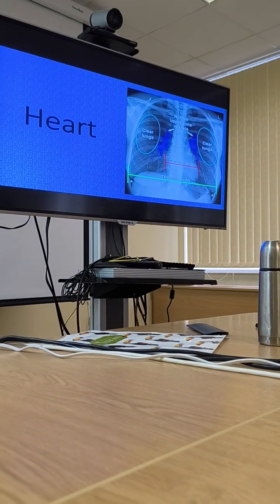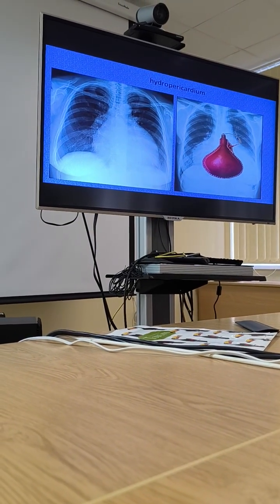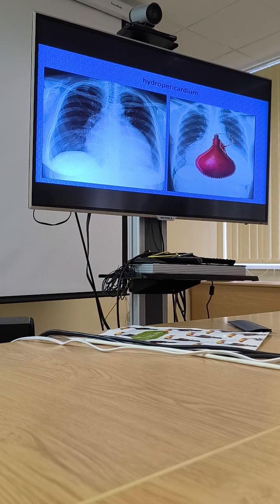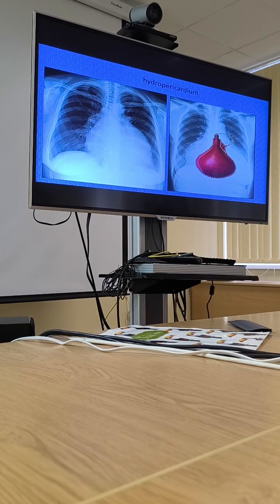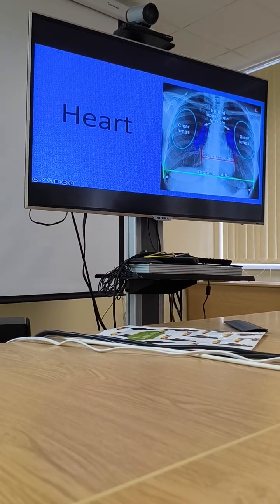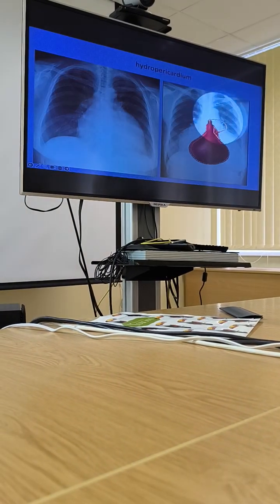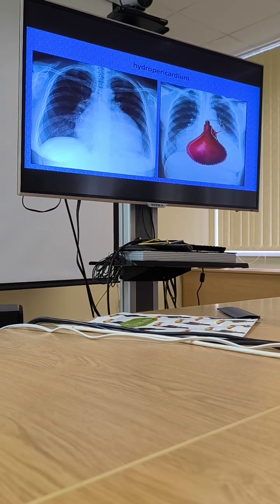First of all, in radiology, what we should recognize is that the shape of the heart is really helpful for thinking about some diseases. If you see, instead of a heart in good shape, something in the shape of a bottle, what do you think the disease is?